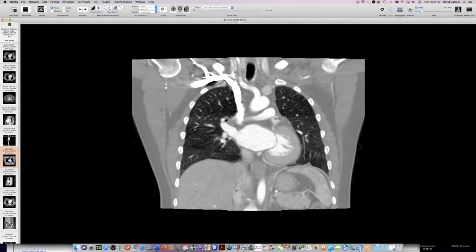So David, the cyst I get because we can't see the epithelium. But with the bronchial atresia, many CPAMs have bronchial atresia in them, and we may not see the CPAM portion depending on how extensive it is and what part it is. Sometimes that hyperinflated lung from the bronchial atresia may actually be the CPAM. But if you look at many CPAMs carefully, you can find atretic bronchi. And if I remember your case, there was an atretic bronchus with a nice mucus plug.